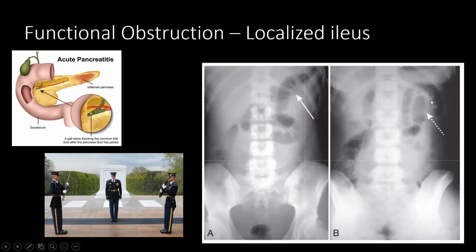These are small bowel loops, and when I take a prone image, these bowel loops did not change in their dilatation. So when I see loops of dilated bowel on supine and prone, two images, that have not changed and are in just a certain place, I will say that these are sentinel loops. Sentinel means the guard.